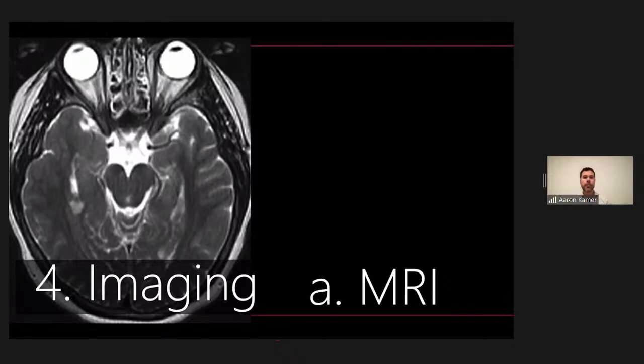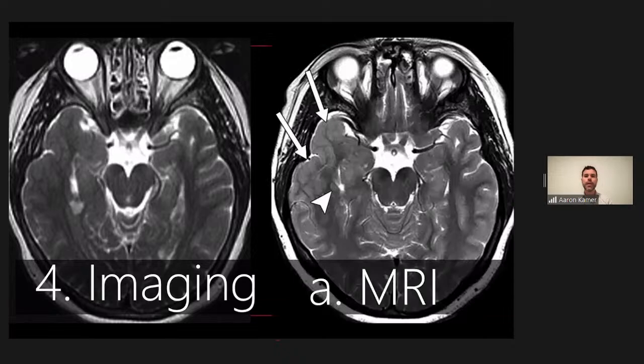In fact, when we have a patient being scanned for seizure, or we're looking back at some old historical study that the patient has had, one of the first questions that I get asked commonly by our neurologists is whether this was a 3T. And here's, like I said, on the left here, I have a 1.5T, and then here's an example of a 3 Tesla magnet. I don't find that the differences are as dramatic as this example usually, but you can see why our neurologists, especially if they're seeing examples like this in the literature, are very, very interested in getting 3T.